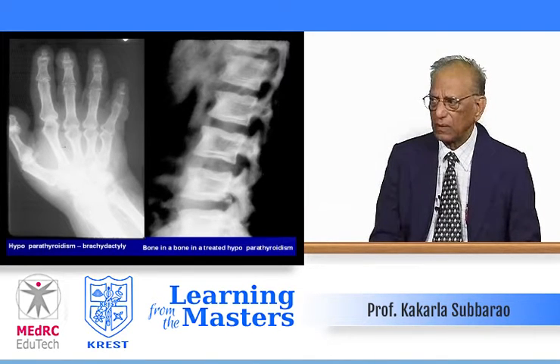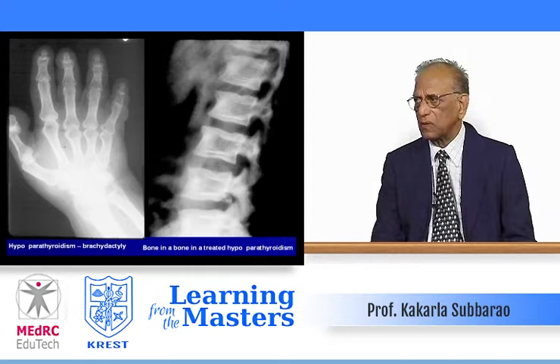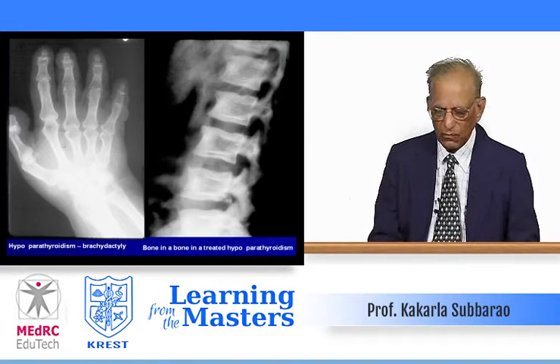Note the brachydactyly. Again, hypoparathyroidism, brachydactyly is pronounced, bone-in-a-bone appearance in the vertebral bodies.